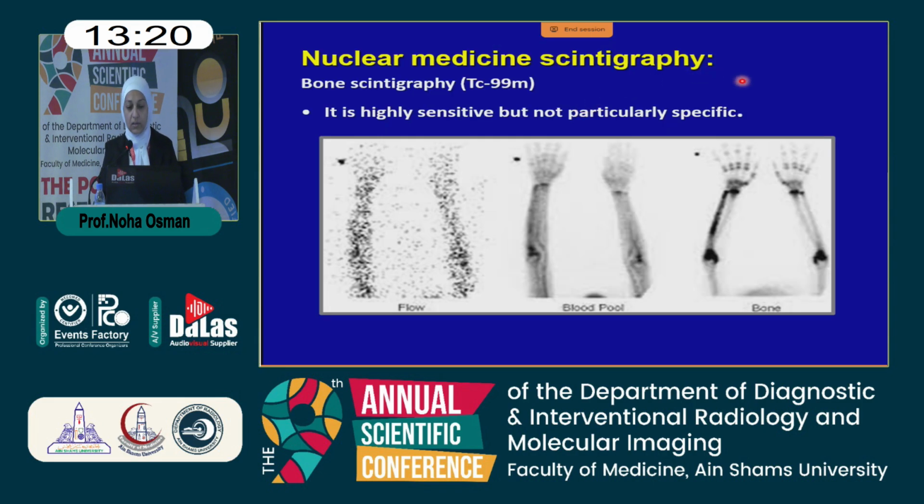Nuclear medicine or bone scanning has a role if MRI is not available, as it also detects early findings. Findings are very sensitive, but not specific for osteomyelitis. There is increased uptake of the isotope or radioactive material in the blood pool and the delayed bone images.